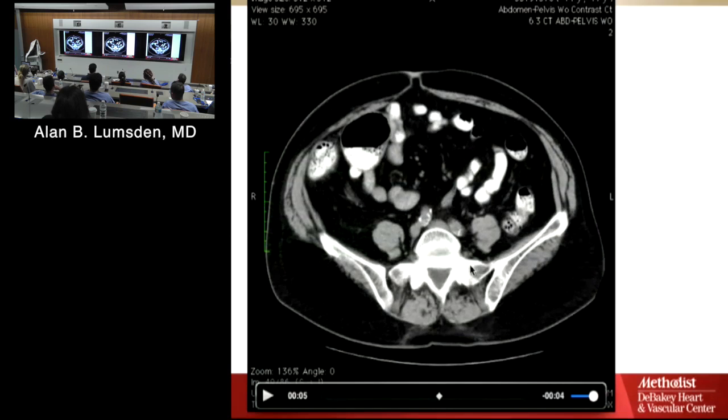Okay. What's that? Get up. Iliac. Left common. Left common iliac, not iliac. You can't say iliac. We'll shoot you. Iliac means anywhere from here to here. What's that? Right common iliac. Right common. What's that? Right common iliac.